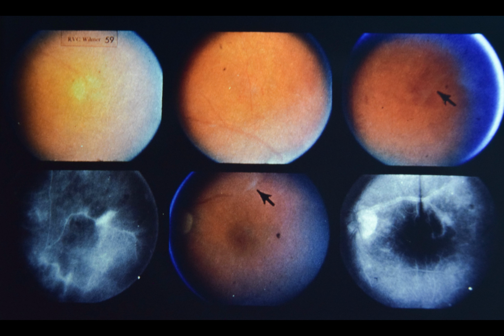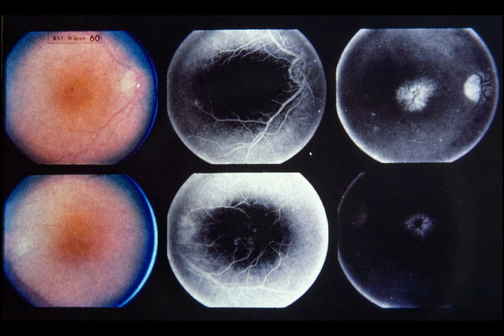Slide 60, pars planitis. This 45-year-old white female has complained of reduced vision and metamorphopsia for 3 years. Her ophthalmologist mentioned that there was dandruff in both eyes, but no diagnosis was given and no treatment was recommended. She continued to lose vision. When examined in February 1976, visual acuity was 20/70 right eye and 20/40 left eye.